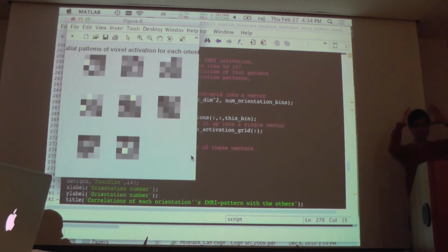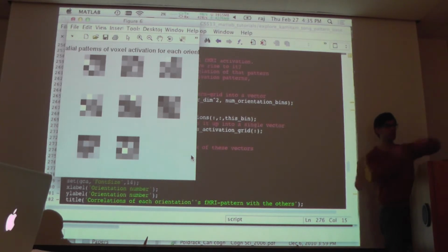Then you write a brain full of numbers: what's the amount of pattern information in this neighborhood, this neighborhood, this neighborhood. So each of those individual steps is preserving some information about the local neighborhood. But what's the first thing that gets done to it after getting that neighborhood? You turn it into a vector.